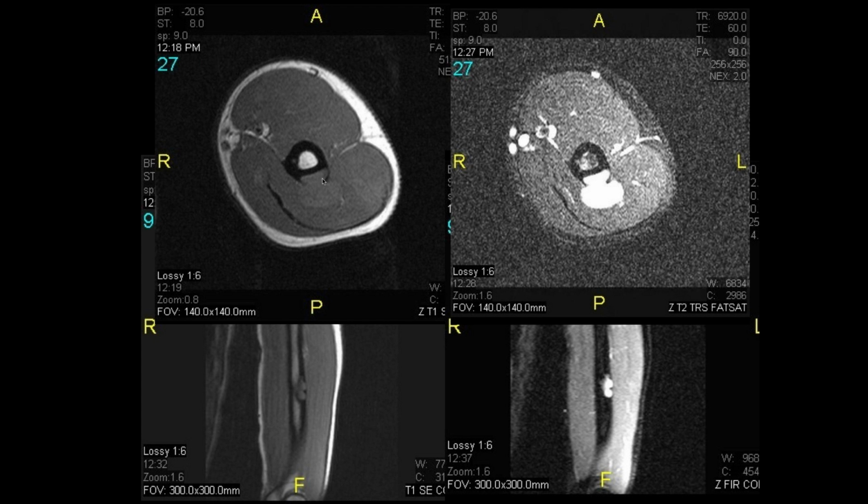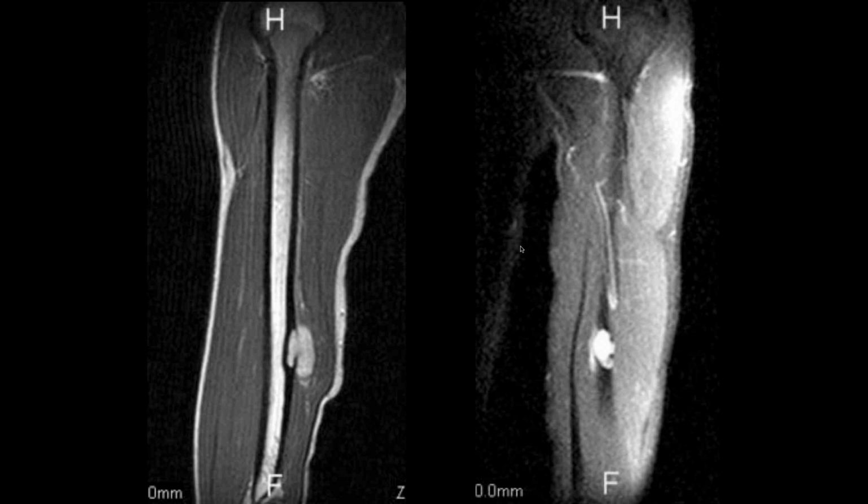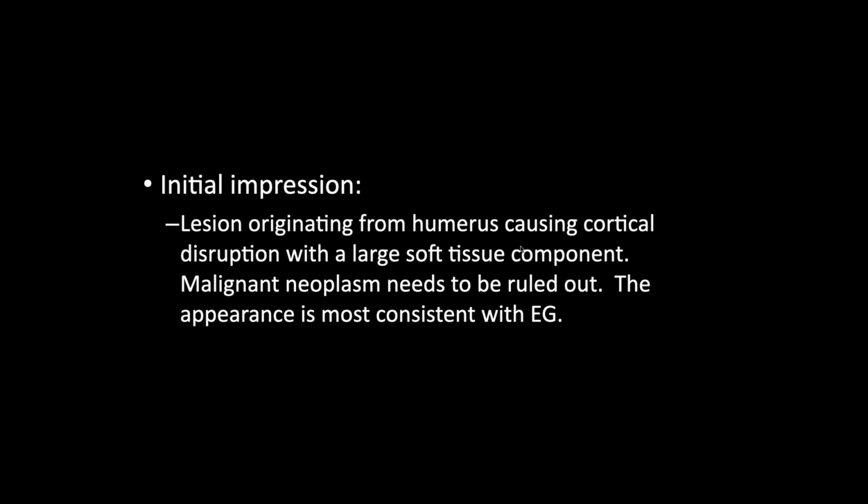Well, here it's kind of low in signal, but it's a little bit brighter than the muscle. It could be a complex cyst, but most cysts are going to be darker than muscle on a T1 weighted image. But it looks very uniform in signal intensity on the STIR, but this isn't properly windowed either. So we might get more structure in it if we windowed it differently. Okay.